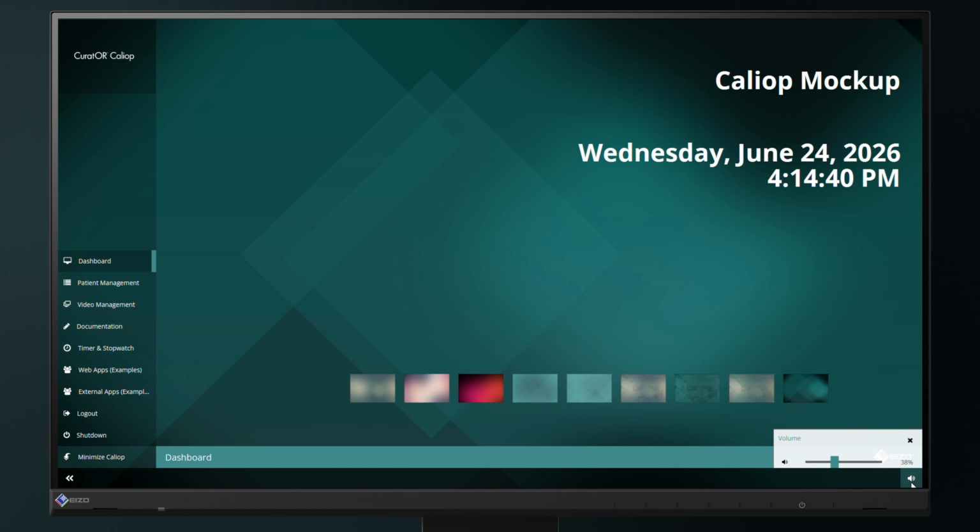to the system. Along the bottom of the screen, you will always see the current selected patient's name, no matter which part of the software you navigate to. This is a key patient safety feature. It ensures you are always aware of which patient's data you're working with while they are physically in the room. The main menu runs down the left side of the screen and is organized top to bottom to mirror the natural surgical workflow, from preparation through to completion.